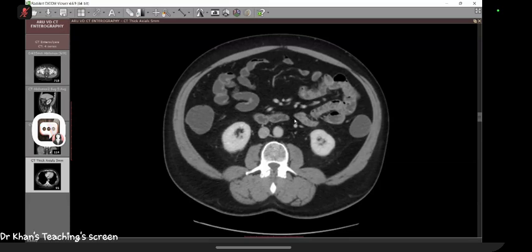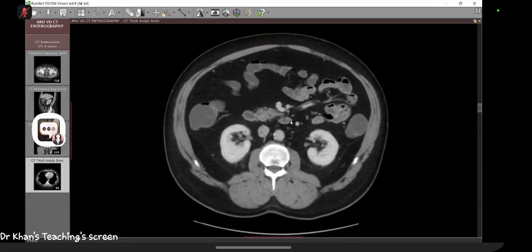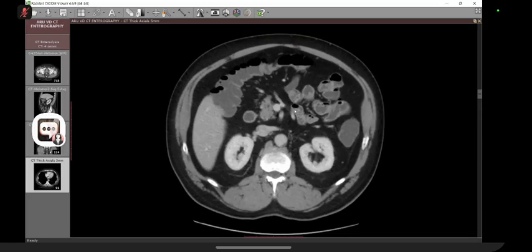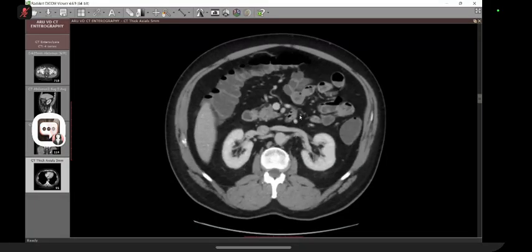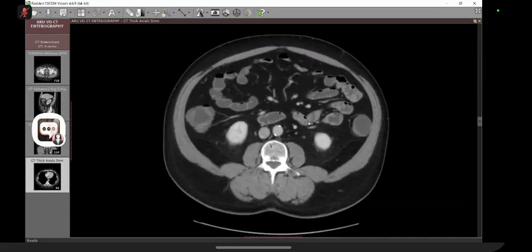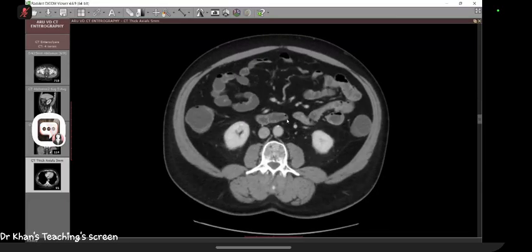It is going to go proximally. So let me trace it. So I'm going up. Here you are, and ultimately it becomes the jejunum. So this is the duodenojejunal junction. And I think you can reach close to this point, or maybe at times distal to this point, through your endoscopes, but not in all cases.